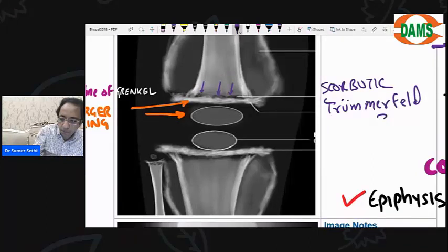These are your subperiosteal hemorrhages.